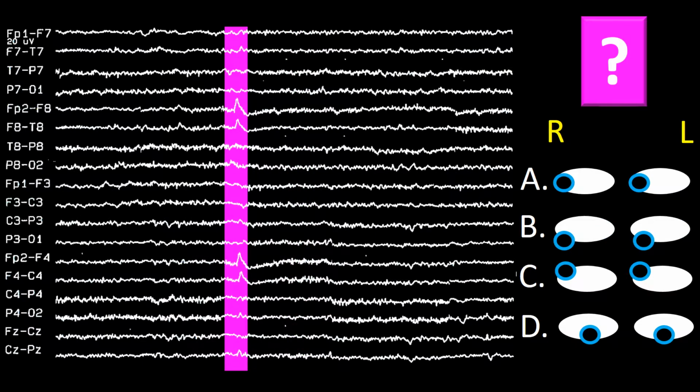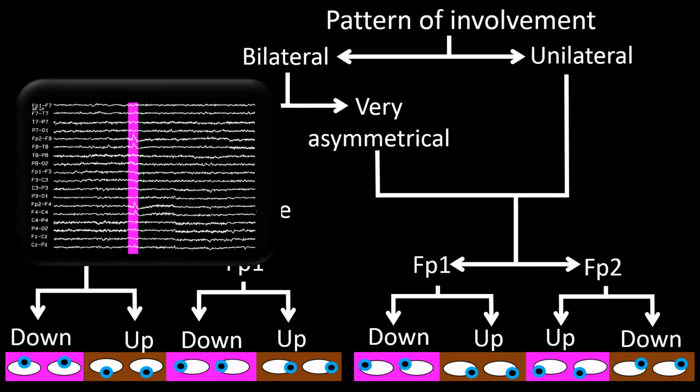Next question. Please take a look at this epoch and choose the best answer from the four choices that you're given. Again, I am introducing the general flow chart.